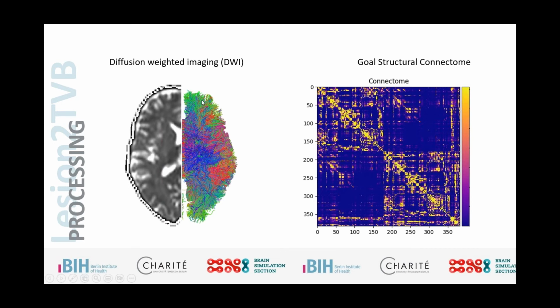And we want to have these nice little tracked images of the brain so that we can then use the parcellation that we had before, right? We have the individual regions of the brain so that we can go through all of the regions and really pretty much just count the number of tracks from region 1 to region 2, so that we can end up with the structural connectome where we have all the regions in our parcellation.